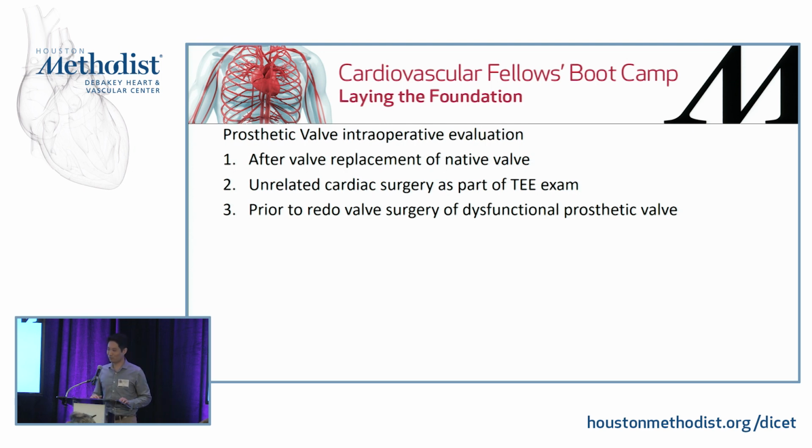There are 3 scenarios in which you would look at a prosthetic valve. One is a native valve replacement: after you fix it and go off pump, you're looking at the valve and telling the surgeon it's good or bad, what the gradient is, and so on. Another is patients who have a prosthetic valve and are having unrelated cardiac surgery, most of the time.